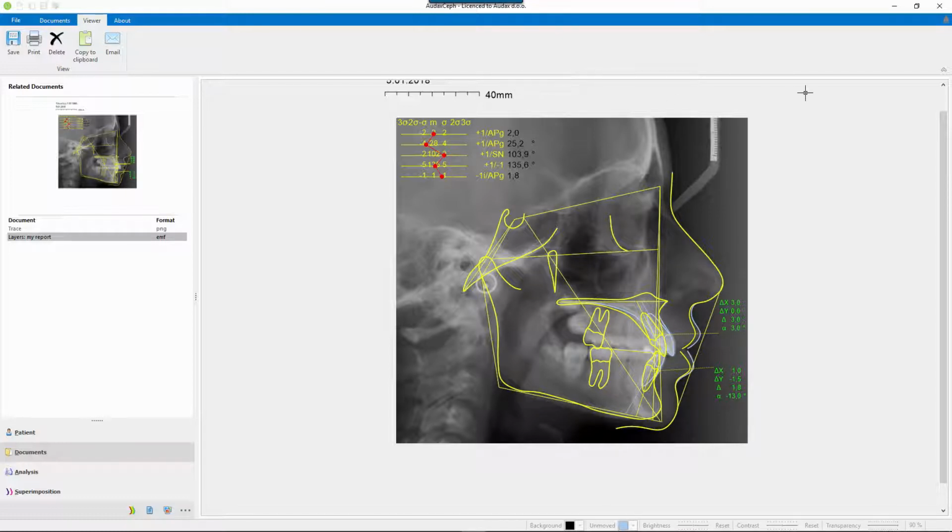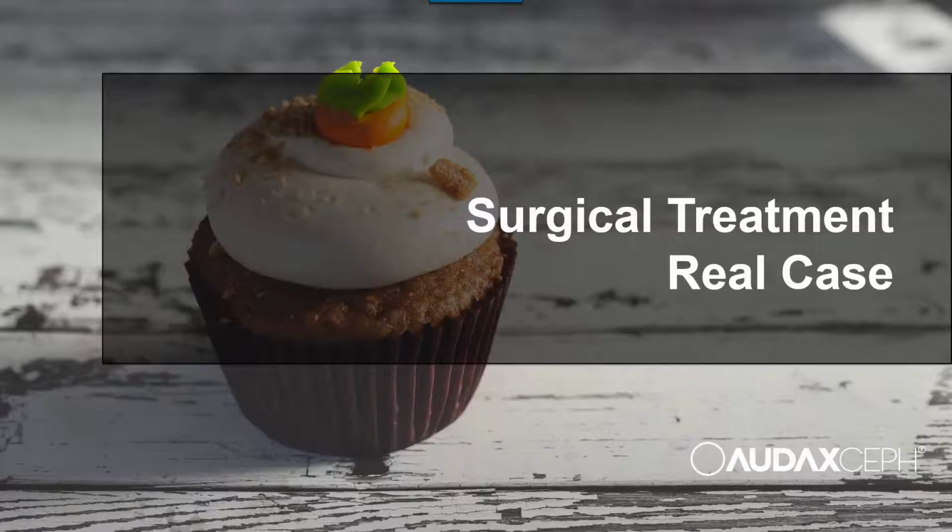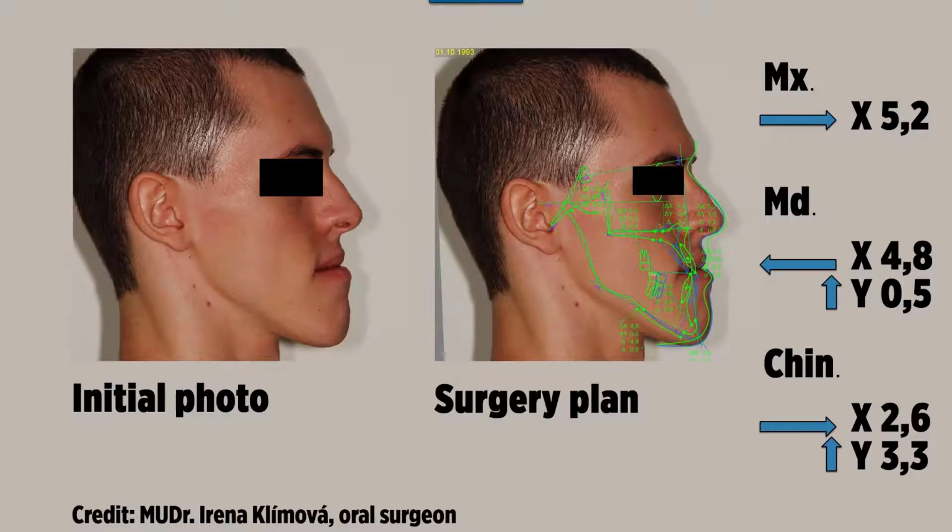Now I'm going to show you. I'm going to use another desktop, and I'm going to show you a real case example. The images were sent to us by Dr. Klimova. She's an oral surgeon, and I would like to thank her for her effort and contribution. There is an initial photo of a male patient on the left side. He was surgically treated. And on the right side, there is a plan done in AudaxCeph software.